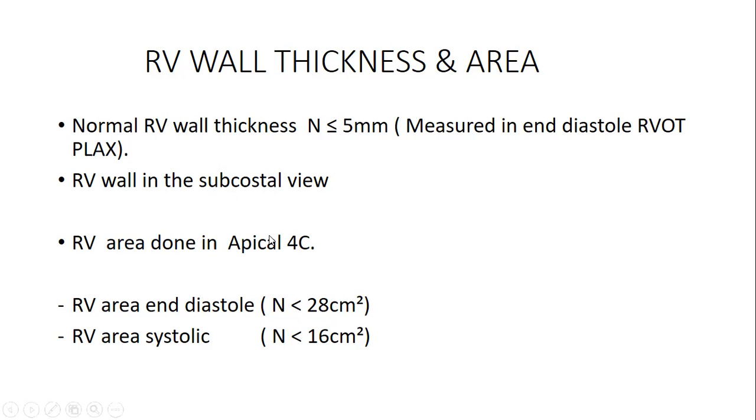When you are picking this RV wall thickness, you also have to remember that there are cases where you can have RVH, right ventricular hypertrophy, in different pathologies that may present on the right side of the heart.